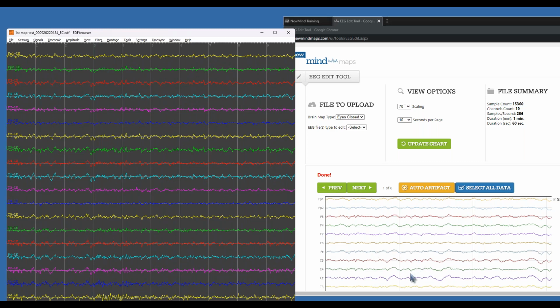If I keep adjusting the amplitude, it thins out a little bit, but you're going to be getting roughly the same data. It's just that in our EDF browser, there's no option to blow up the amplitude. So it'll be similar, but slightly different.